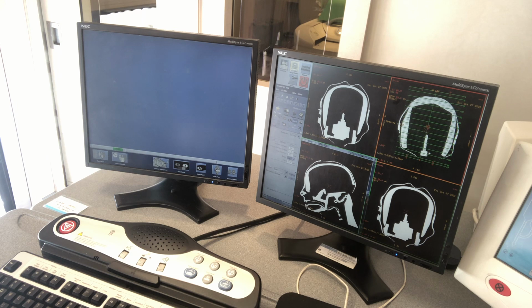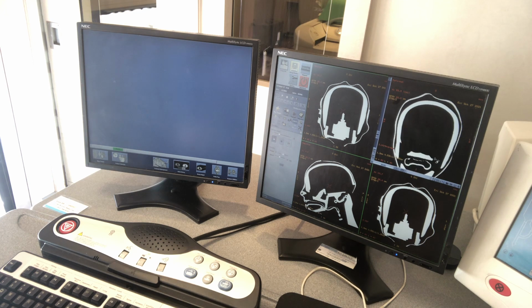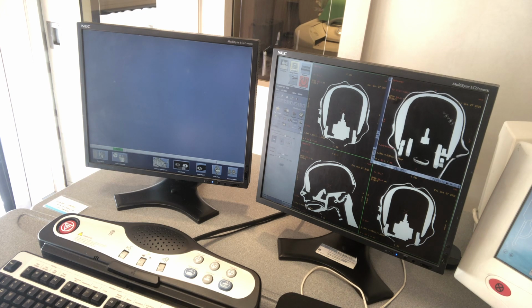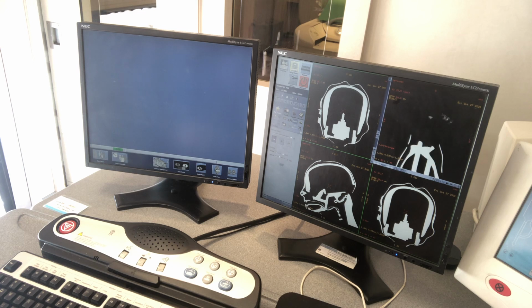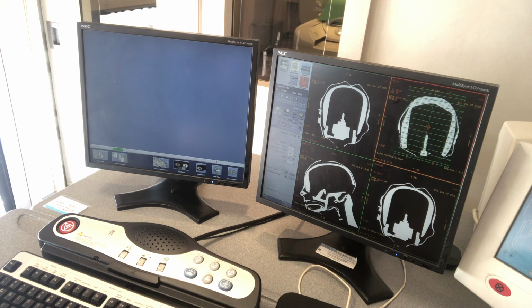And then you're going to preview them. It's going to go through real fast, and then it'll come through slow. And you see you've got everything on the outside there. So if you're good with everything there, you're going to hit close, and then you're going to put OK. And you'll hit close one more time.